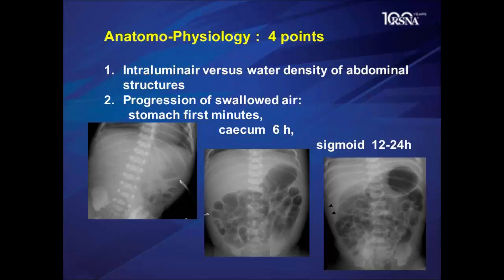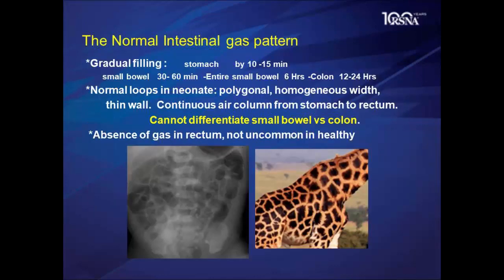The key timing is 24 hours. By 24 hours at most, air should be within the sigmoid, hopefully in the rectum.